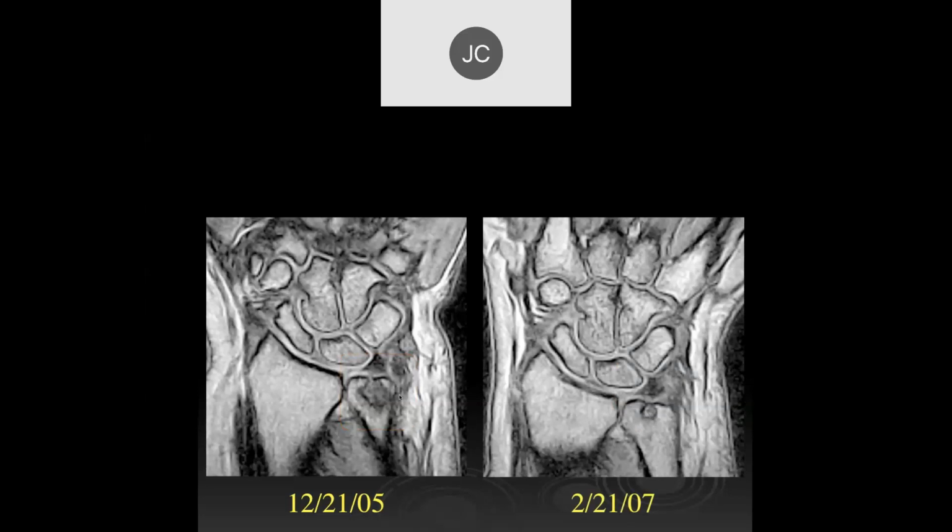Well, I believe what happens is that what we're seeing here is an area where you have dense inflammatory tissue around trabecular bone. In the center, you dissolve the most trabecular bone, and once you dissolve the trabecular bone and there isn't any left, there's no longer a scaffold there to allow the bone to heal if you stop the inflammatory process.